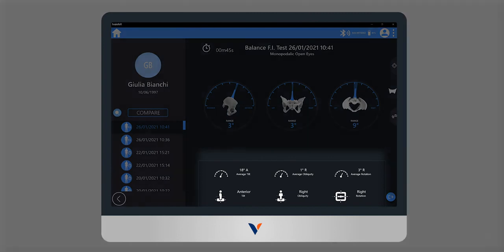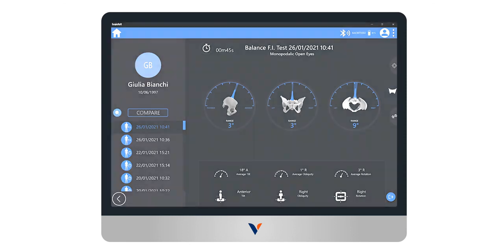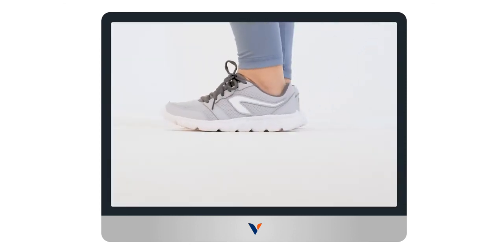In the box below, we can visualize the average of the pelvic obliquity divided into the 3 anatomical planes. This allows us to insert further elements of evaluation within the clinical reasoning. In fact, in a subject with good postural control, we expect to see a rather limited range of movement of the pelvis, as the correction strategy of the balance perturbation should take place at the ankle and knee level.